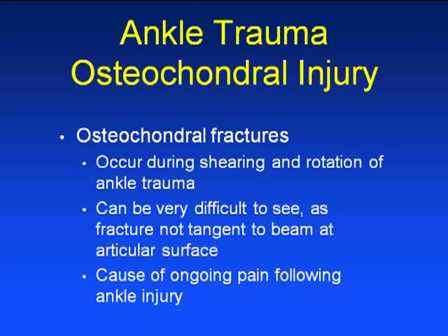Now, the last thing I want to talk about on the ankle is osteochondral injury. The reason I include these here is that in my own practice, my own life, being someone who stares at these, I miss these injuries. They are notoriously subtle. And my rule of thumb is that when somebody gets evaluated for a potential ankle fracture in the ER, comes back a week or 10 days later and says they still hurt, I work from the assumption in my mind that they have an osteochondral injury, and if I can't see it, I even sometimes, depending upon whether or not I think there's some secondary gain going on with the workman's comp angle, I will say, if you guys are worried about an osteochondral injury, go get an MR to be able to see it.